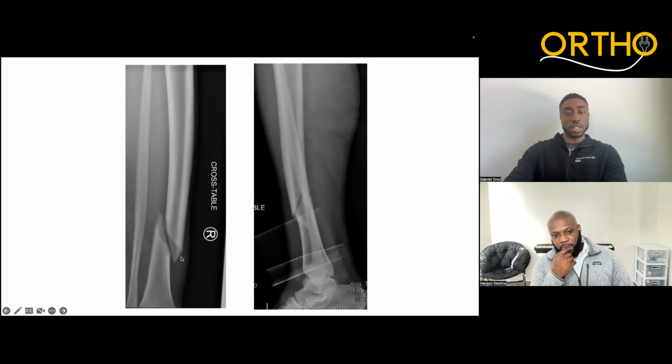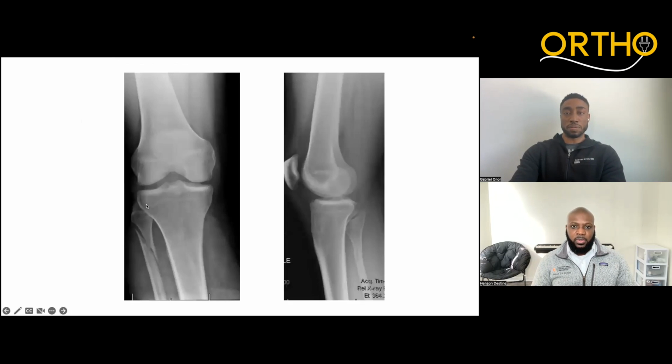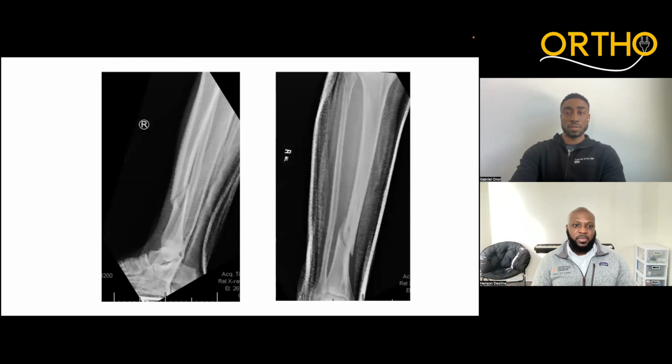The twisting energy comes up, causes this fracture in the distal third of the tibial shaft, and then travels up through the interosseous membrane and exits at the proximal fibula. So it's one twisting mechanism, one energy or one event that caused both of the fractures, and that energy travels through the sheet. Okay. Makes a lot of sense.